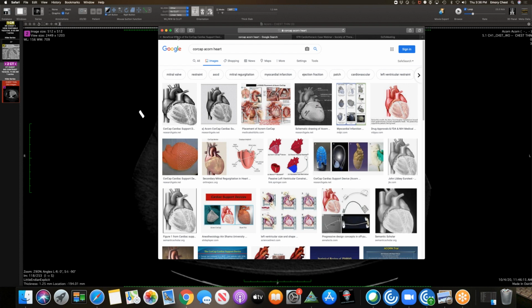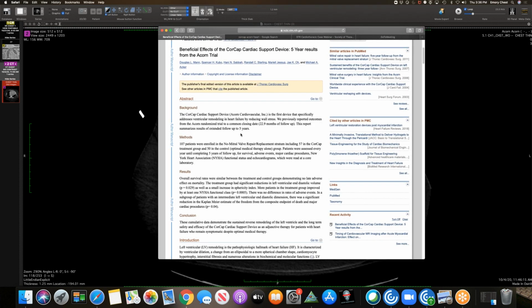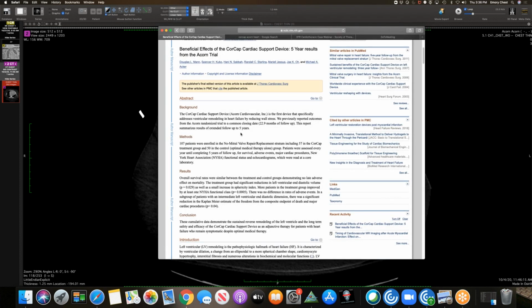Annoyingly, this paper talks about a CT but doesn't actually have the CT in it. But this was a patient who had what they thought was mesothelioma. They had a bunch of pleural masses and an effusion on one side, and they did a biopsy and found that it was a granulomatous reaction to silicone. So yeah, this is all chronic silicone.